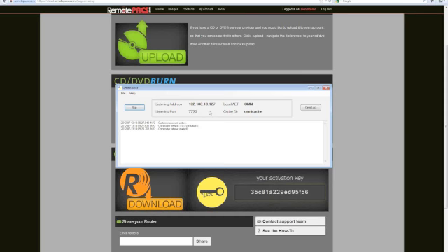It's better to set the local machine where this software is installed to a static IP address in the local network. We do have a quick guide on how to do that. If you don't have an IT staff that's willing and able to help. So that's really the bulk of how you get your studies in there.